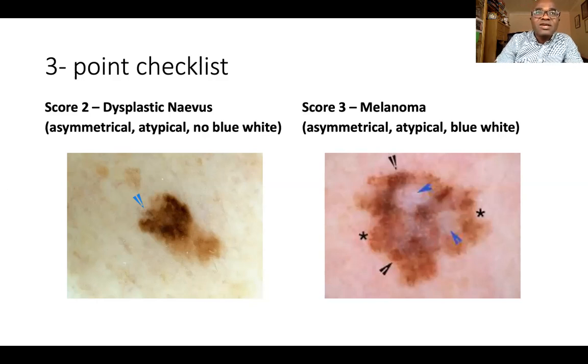It's just like making any descriptive features of lesions in dermatology. You use macules, papules, plaques, and things like that. The more you use them, the more you see them, and the more you become familiar with what you're looking at. This is another 3-point checklist.